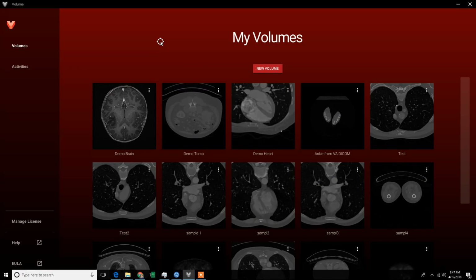For various technical and proprietary reasons, sometimes medical devices compress the DICOM files that make up the scan from the device. Currently, VIVED Volume cannot open compressed DICOM files. In fact, if you try to open compressed DICOM libraries, the application will lock up and you will have to close VIVED Volume. There are ways to decompress compressed libraries, but there is a significant loss in volume quality when decompressed DICOM libraries are used to create volumes.